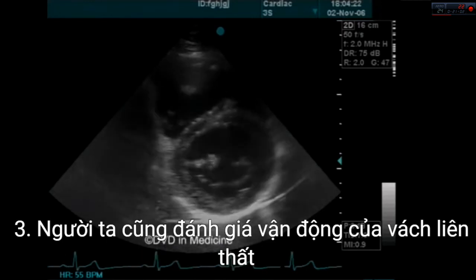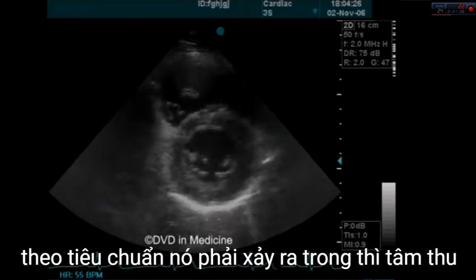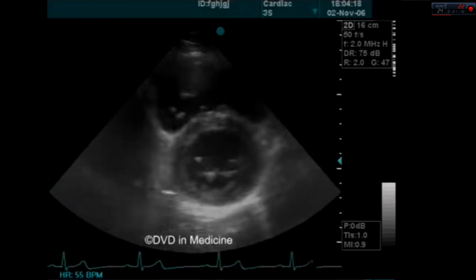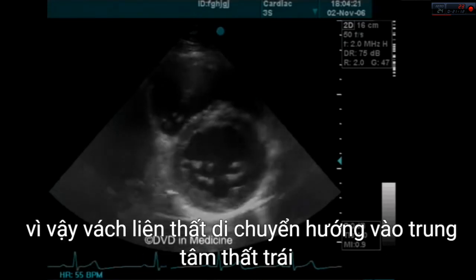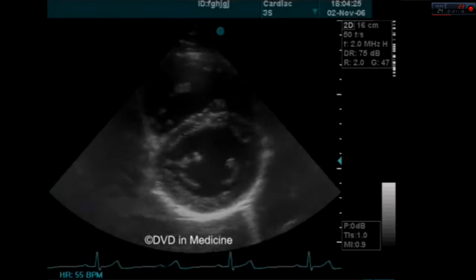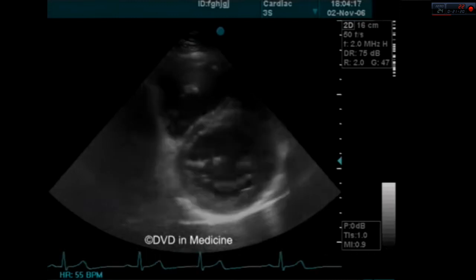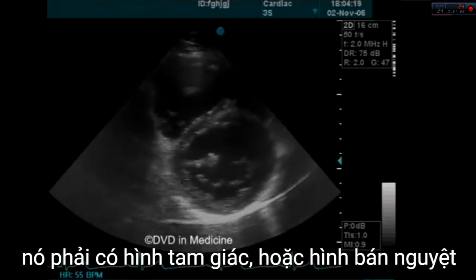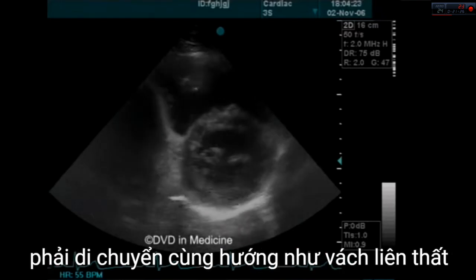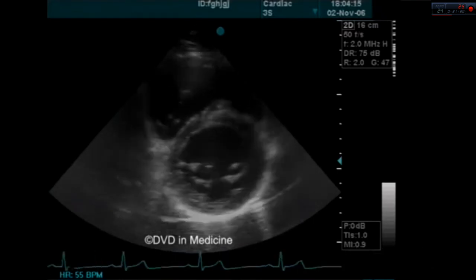3. One can also assess the motion of the interventricular septum. As a norm, it should occur during the left ventricular systole. Thus, the interventricular septum moves towards the center of the left ventricle. 4. One can assess the shape of the right ventricle. It should have a triangular or crescent-like form, and the right ventricular free wall in systole should move in the same direction as the interventricular septum.